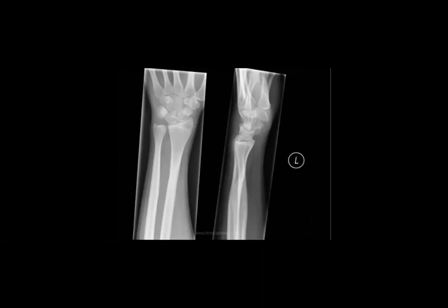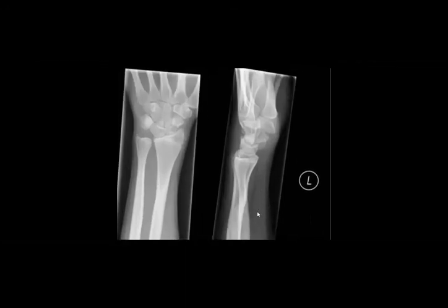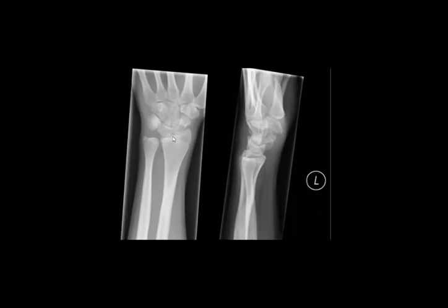Now this one is the easy one. When you look at the wrist, the most common fracture that comes to you in practice, in this one, it will be the scaphoid fracture. Okay, and search for any association of scaphoid.